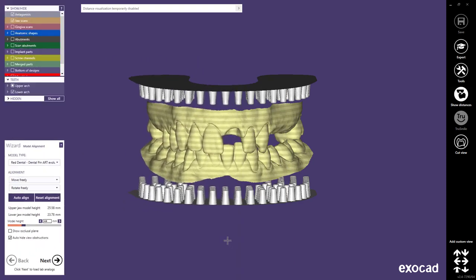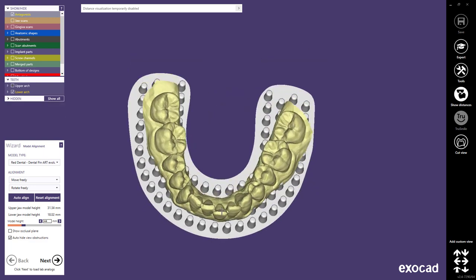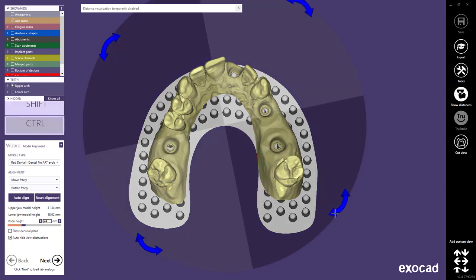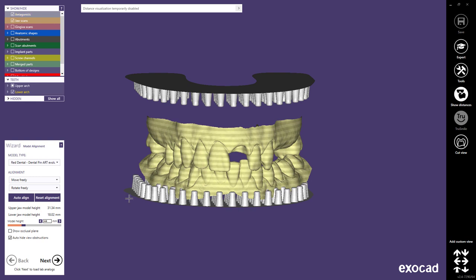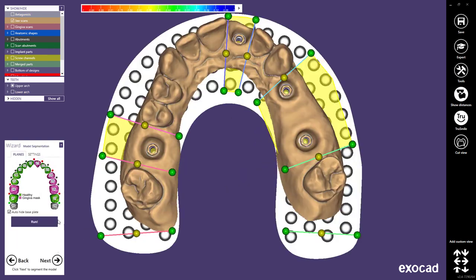You have a possibility to create implant models with specific pre-manufactured base plates, such as Baumann, Reddental, or others. The plates will be visualized, and you can align the model by moving or rotating. Areas marked in red will be removed. When using the model with plate, the next step is model segmentation.